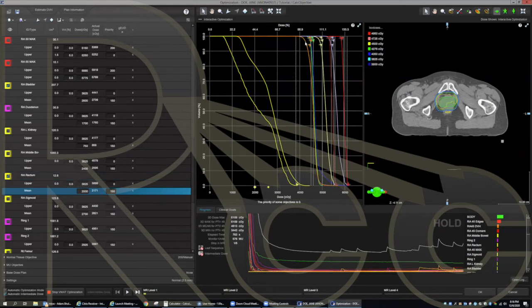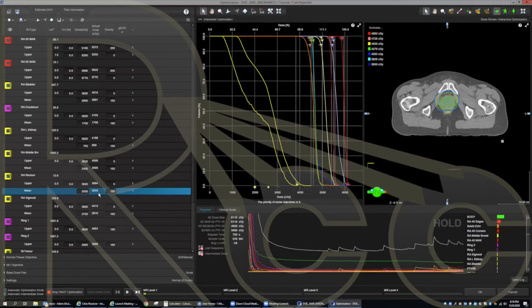It pulled my sigmoid. Let's see if it goes, pulled my PTV, see if it goes back up. It should. Well, the thing is, it's a good idea that you're putting the CTVs just to show, because you don't want those to drop. Of course, the PTV is what you care about at the end, but if you see that dropping a lot, that means that structure is going to ruin your plan. Right, right. That's what's visually nice to have them there.